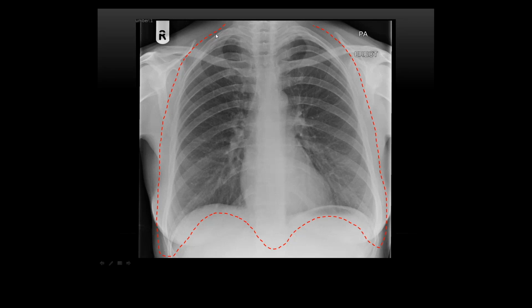But also, if patients have had any trauma, it'll help you to decide whether they've got a pneumothorax, pneumomediastinum, anything like that, because you might see some subcutaneous emphysema. If you see subcutaneous emphysema, it might give you a hint at where there's a rib fracture. So it is really good to look at the soft tissues. Also, don't forget to look below your diaphragms for pneumoperitoneum.